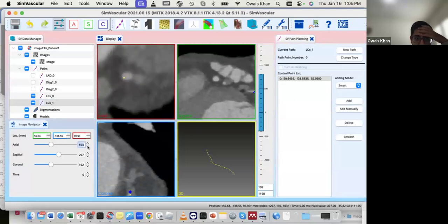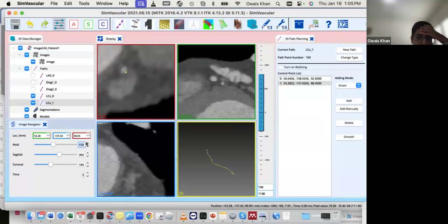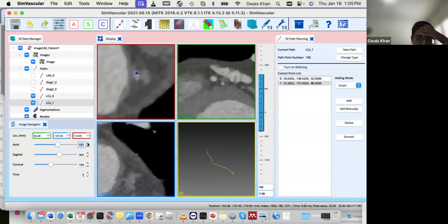Folks, in your images, you might have your own troubles that I probably don't know of, but once you do a couple of them, we can go iterate, right? So next week you can try on your own, and then Anna and I can help you correct some of your images. Sometimes when the branches get really small, it just gets hard to see when they're branching out. So you should look at a sketch of a coronary anatomy tree, just so you align yourself when you're branching all of these out.